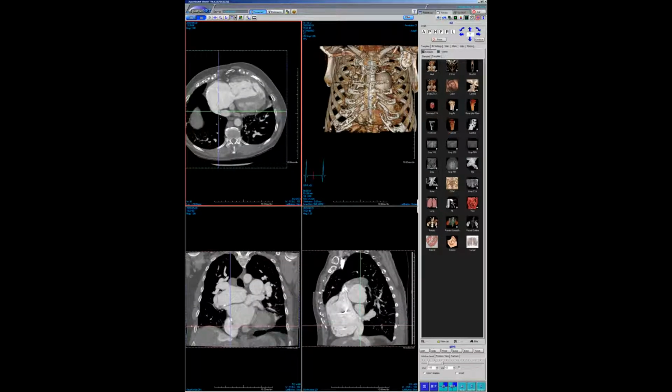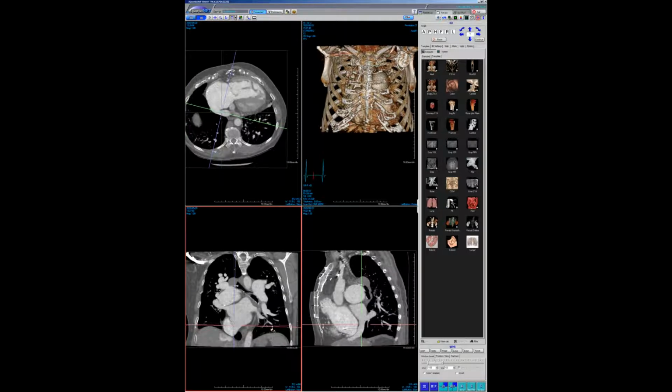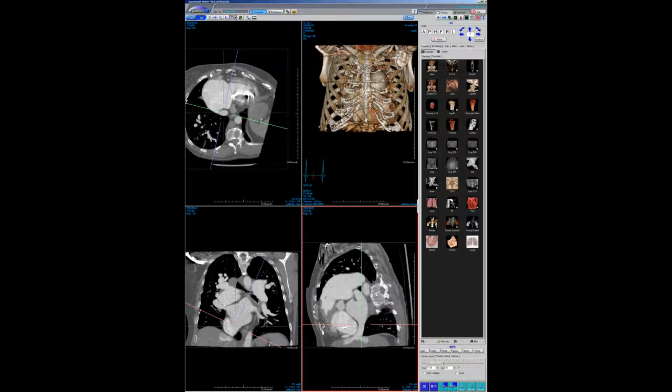So this is an inferior sinus venosus. Interestingly, in this case, it's not associated with a PAPVR. I've seen a few inferior sinus venosus not have PAPVRs. All of the more typical superior sinus venosus, everyone I've ever seen has had a PAPVR, with the right superior pulmonary vein coming into the SVC.